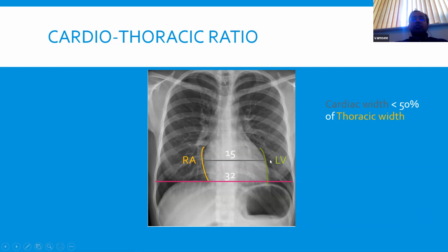What you would see is actually the border of the left ventricle. The right ventricle and the left atrium are not normally visualized that clearly on a standard PA chest X-ray. There are other certain indications you look for, and they can be indirectly seen in radiographs, especially on lateral views or in things like barium swallows and so on. But you guys don't need to worry about that for your exams.